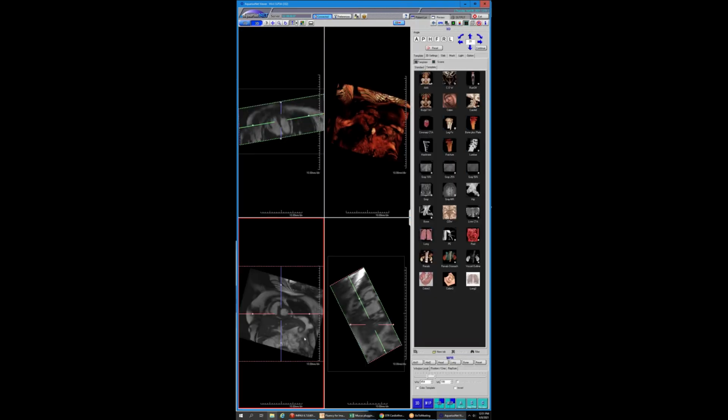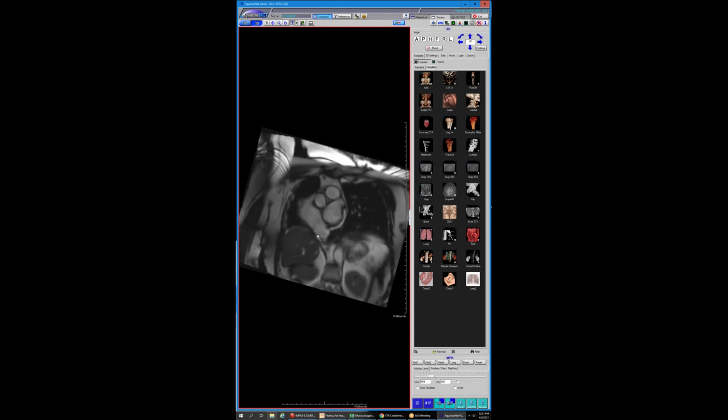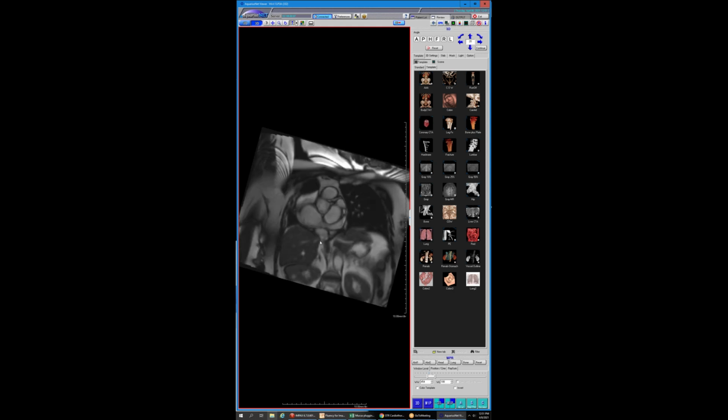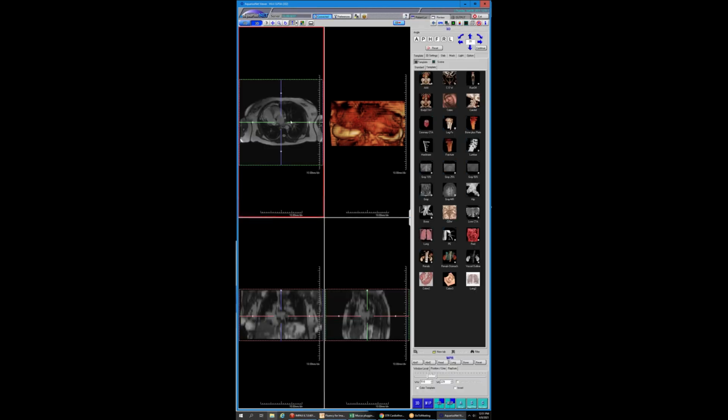I'm trying to find the one that really showed it well, and I'm never going to be able to find it. That vessel gets really compressed. And because of that, you're not having the significant shunting that you would expect to see. I can't find it, but anyways, you don't have the significant shunting. We see this occasionally, and just because I don't do a lot of peds anymore, the majority of cases do happen to be in asymptomatic adults.